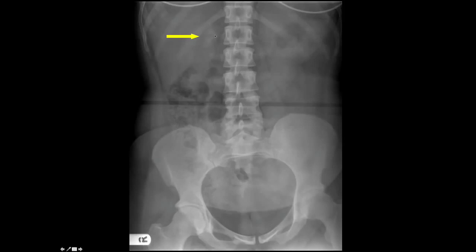They're like big marbles, aren't they? Cholesterol stones. That's right. Yeah. So that's our calcification. I find that harder to spot. I'm glad there's a big arrow there showing us where it is. It is difficult, but if you know what you're looking for, you can see. But again, I haven't seen that. Doesn't matter that lots of people will have it. If the patient is symptomatic, then it becomes more important.